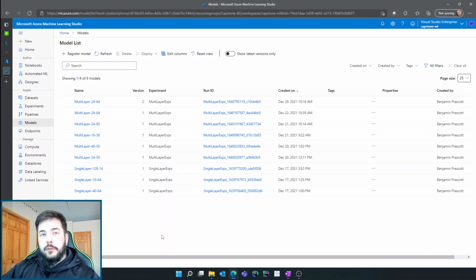When our current training run is finished, which will take a while, so I'm not going to pause the video for the whole thing, but these are past runs that were done that will be treated exactly the same. You can see the run ID attached to those.